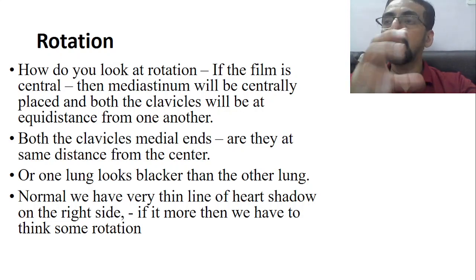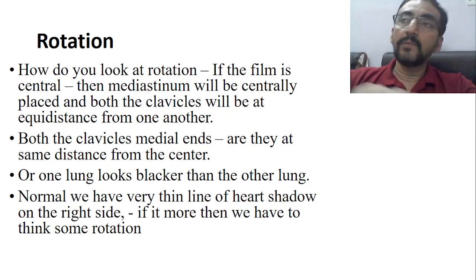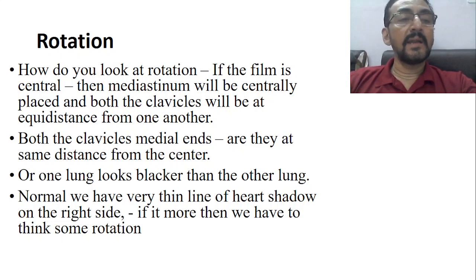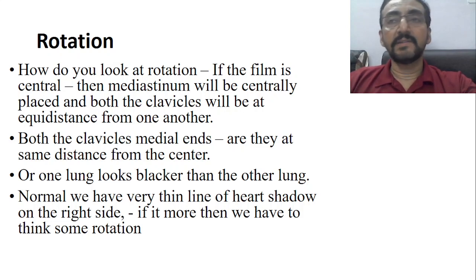Now if it is not centrally placed, you won't have equidistance of both clavicles from the center on both sides. That again we will see. Both the clavicles' medial ends should be at the same distance from the center. This is what we have to see. Are the medial ends of both clavicles equidistant from the central line? If so, it suggests that yes, the X-ray is centrally placed.